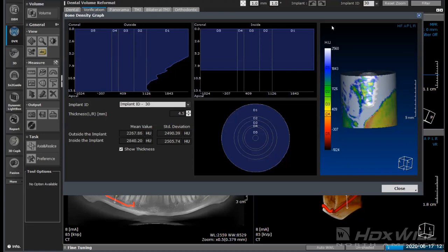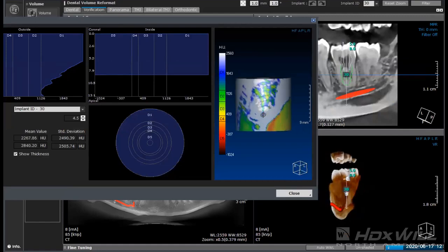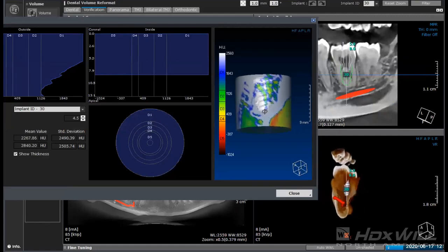So I'm just going to scoot it over here so I can left click on the top of that panel, and I can actually look at the 3D model as I'm looking at this. As I move it in real time, I can tilt it to where I can see exactly where it is in the 3D model. And what we find is that this correlation is actually correlated to that undercut that we had before.